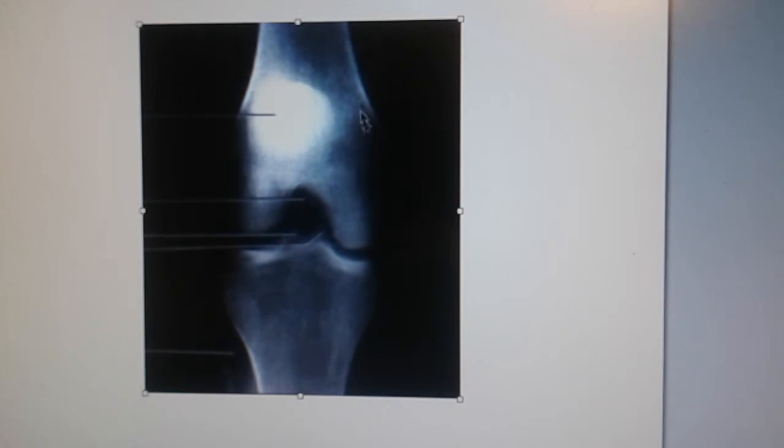So here we're, again, collimation. You want to have your joint centered in the image. You want to have an open intercondylar fossa here. You do not want to see the patella apex. Actually, you don't want to see it in any of the images that we've talked about so far, except for the lateral because it's in profile on the lateral.